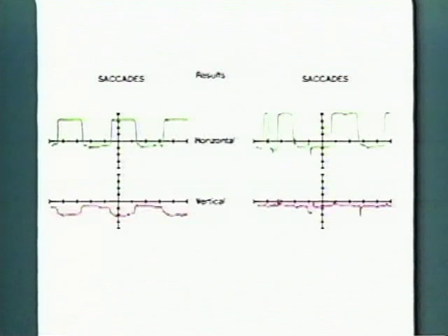In the second example of the overshoots, we also see some abnormality in the patient's ability to become focused on the target, demonstrating two smaller saccadic tracings, both of which are abnormal.